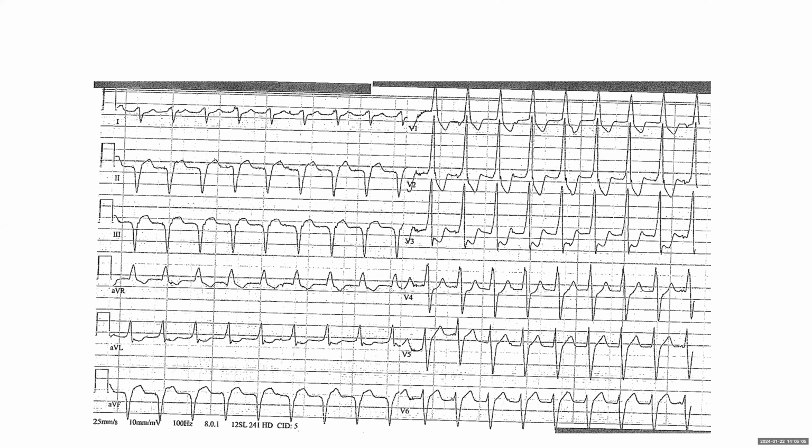RVH, again, you have to be careful. Once you say this is VT, the morphology, you can describe it, but it doesn't translate into diagnosis. For example, you cannot say RVH because there is a prominent R wave in V1 more than 7 millimeter. Because this R wave came because of VT, where the VT is coming from produced a prominent tall R wave in V1.